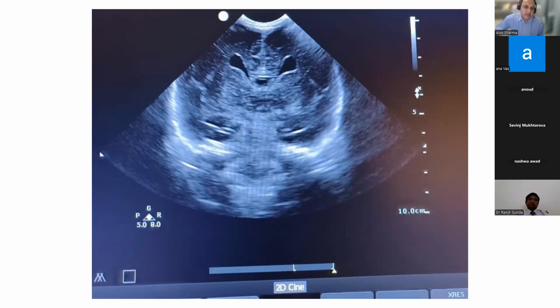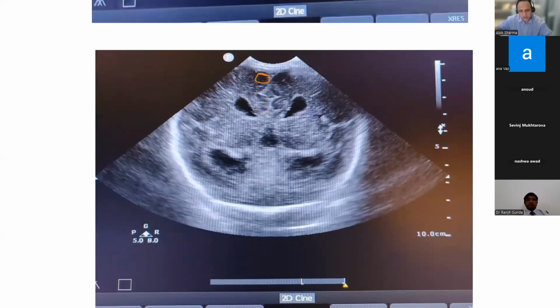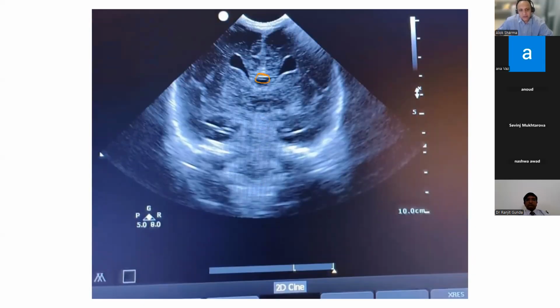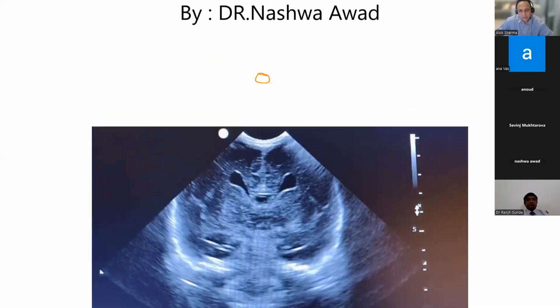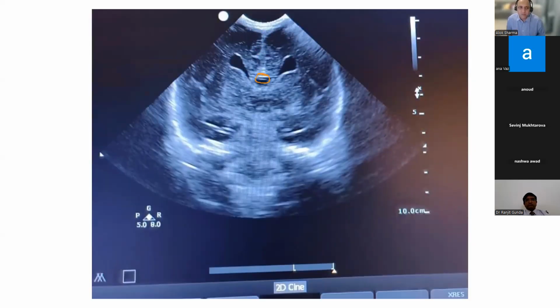There is a little bit of corpus callosum visible. I'll just show you exactly where. So just over there, you can see. And as you move forwards, if you just go forwards to your next image, it is not shown at all. And this is further back. Let's go back to the previous image and the one before that, further in front. Did you take an image before? No problems. It's okay. That's all right. This is good enough for us to make a diagnosis.